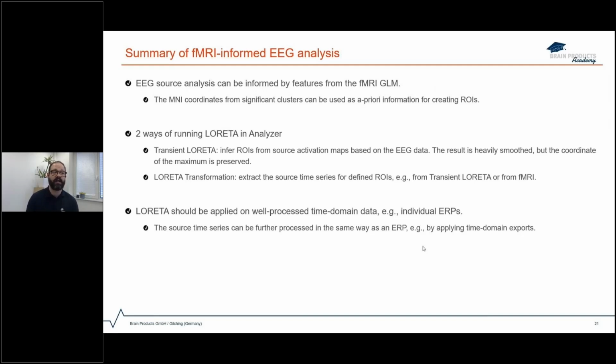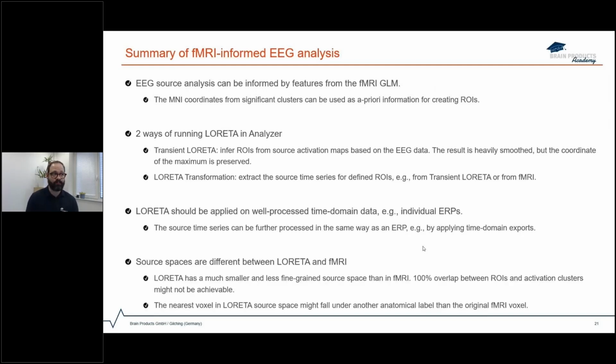So you can't apply this to frequency or time frequency domain data or anything else like t-values or so, time domain data. However, the result is then also a source time series that you can process further. So you can use, for instance, time domain exports like you would use for the ERP.